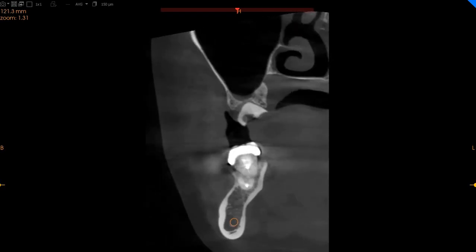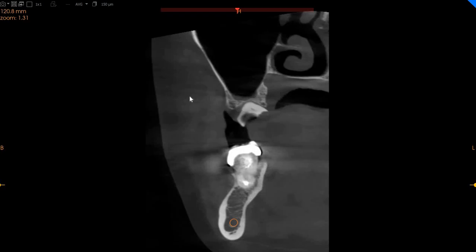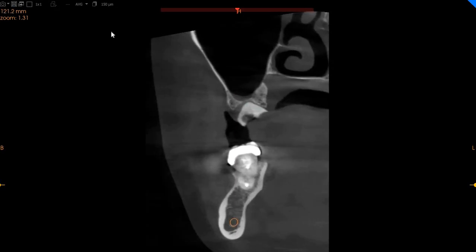And in the region of the 7, we definitely see that we've got no bone height and we have limited bone present beyond the roots. 12 millimeters of ridge width, but only approximately a millimeter of height. No sinusitis can be seen, but we can see that the bone beyond the roots is extremely porous and almost communicating with the floor of the sinus right here.